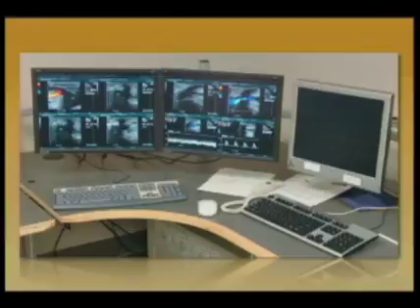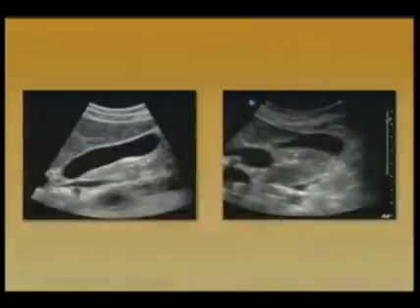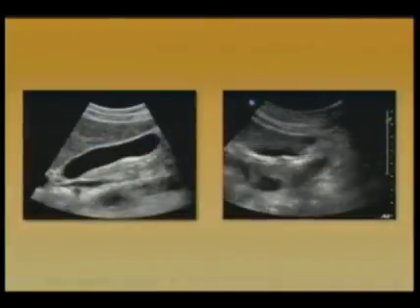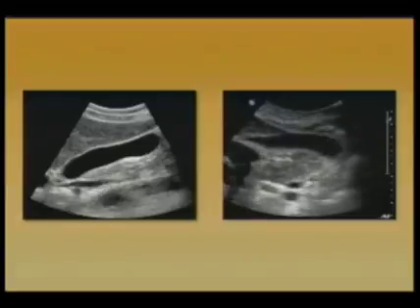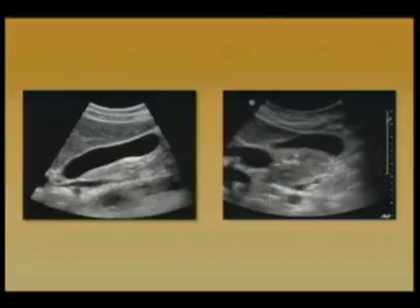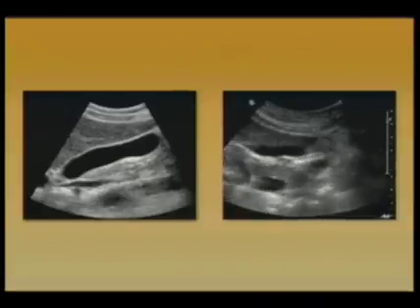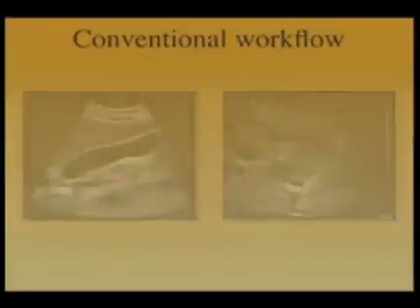Now, why bother doing this? Certainly traditional methods of viewing ultrasound images, such as in this ultrasound PACS system that we have at UAB, have served us very well for many years, whether it's using static images, as in the image of the gallbladder on the left, or 2D real-time clips, as we see in this clip of the gallbladder on the right. That served us very well. What can 3D possibly offer us here?